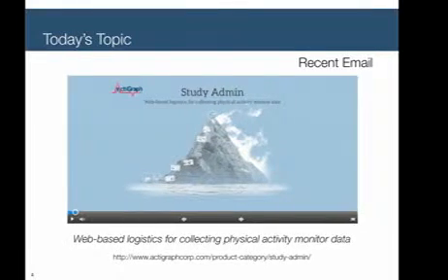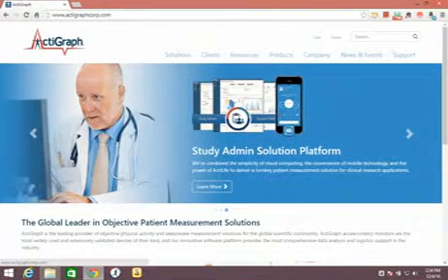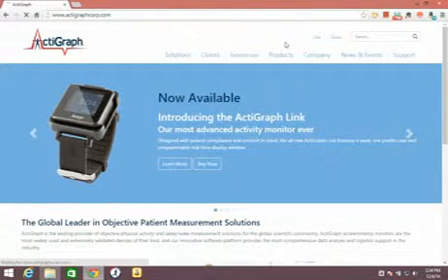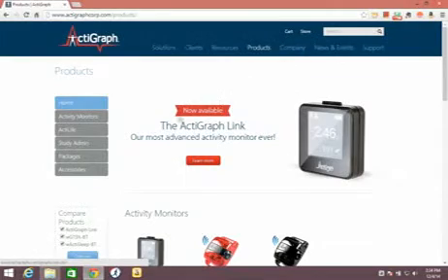But rather than bore you with a hyperlink that you're going to forget as soon as we finish this presentation, I'll just show you exactly where it is. If you're on our website, under the products page, right here where this tab is, you click products. In that products tab, on the left, you'll see a study admin link just below ActiLife.